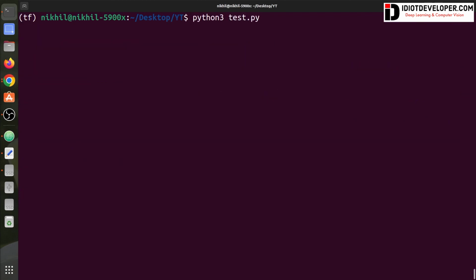Let's run it again and see if any more error is there. Okay, now you can easily see the progress bar. So this way we can easily see how many iterations are done out of 612 and how much time it's gonna take. So it's gonna take 30 more seconds. It has taken 15 seconds.